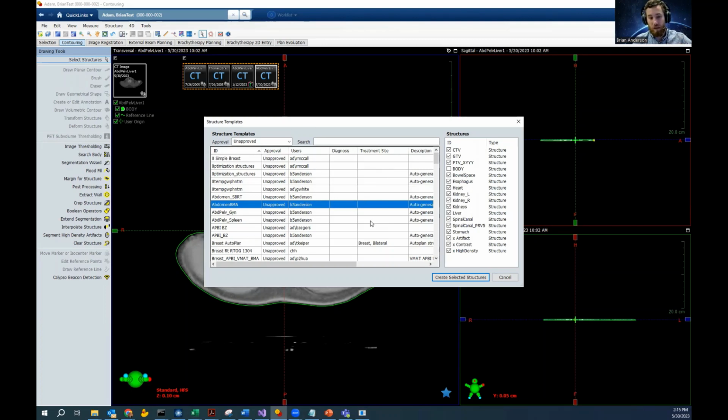So the benefit of our program is that if you want to make a change to something that is listed across several of these, then you can throw it all into the template maker on Airtable, make any changes, and then write it directly back into this space without ever having to open these up and change them manually. All right, so let's look at what this looks like from the program side.